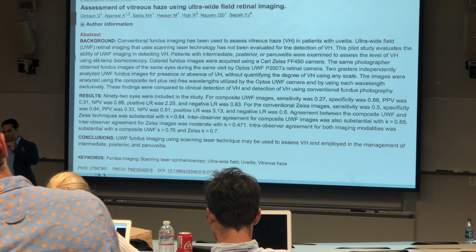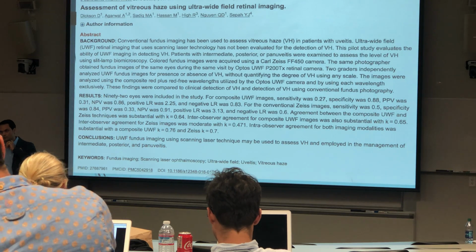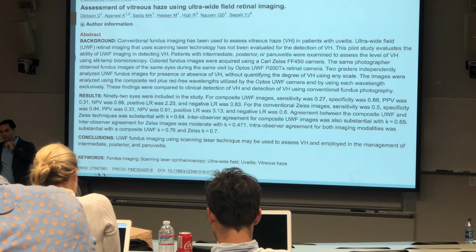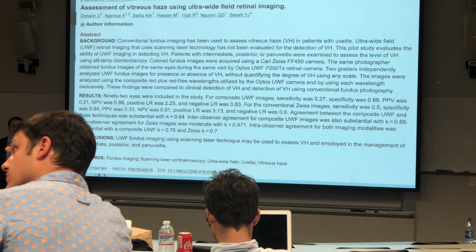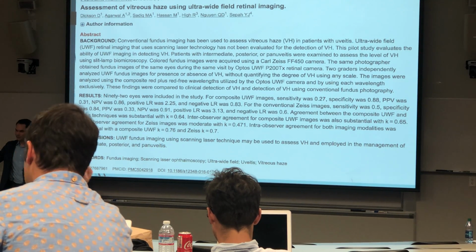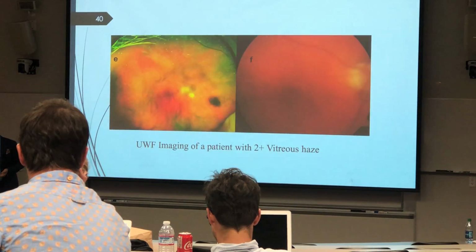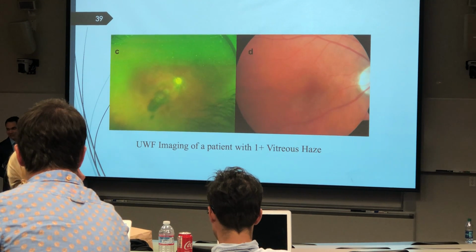I've always felt that the haze you see from Optos is just haze. I always have a hard time distinguishing the haze with vitreous to PSC, posterior capsule, on the Optos photo. Is there, how do you do? So Optos has a function where you can actually do stereo images. That stereo image will give you some depth perception. That's one. Okay. But you're right, with the Optos, for example, this particular image, we don't know where this haze actually is. It's haze, but it's just haze.